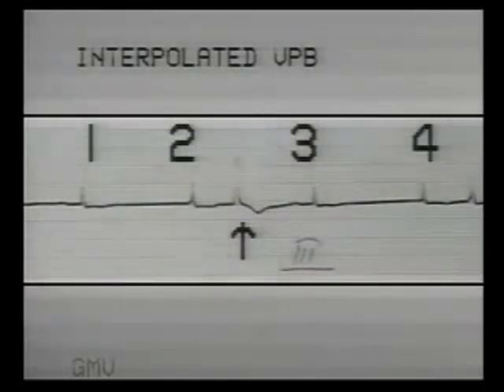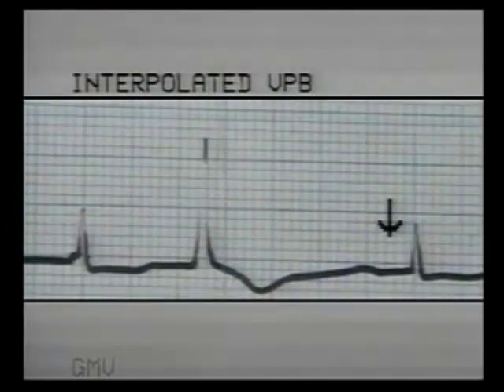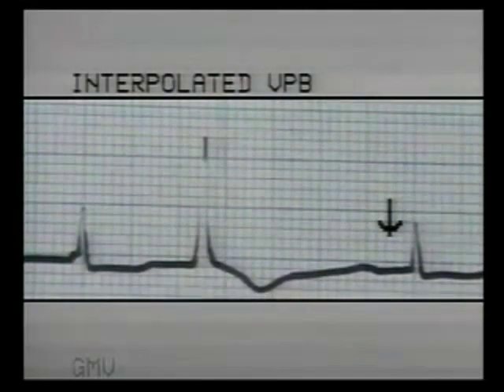The only effect that it has on the next beat is that the PR interval is prolonged, delaying the QRS complex slightly. Otherwise, the sinus rhythm is undisturbed. Note the prolonged PR interval in the succeeding beat.